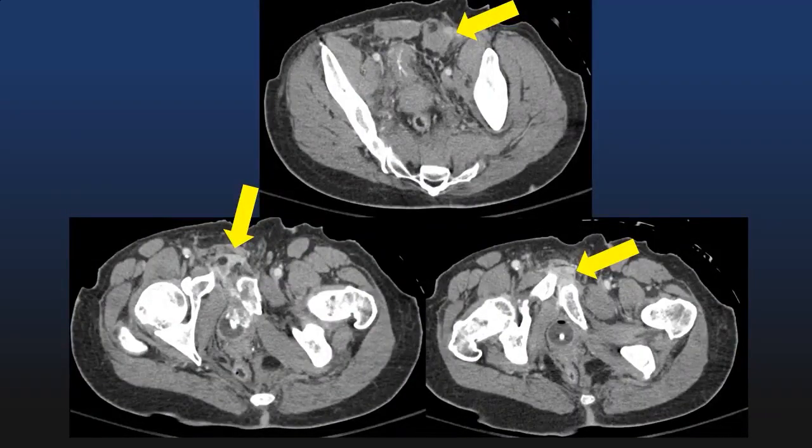Another trauma case, another case with clues in the anterior abdominal wall. Notice that there is a fracture of the left pubic symphysis and that there is expansion of the left rectus muscle compared to the right. Also, there's high attenuation at the pubic symphysis. So somebody certainly were worried about pelvic trauma here, potentially with active bleeding.